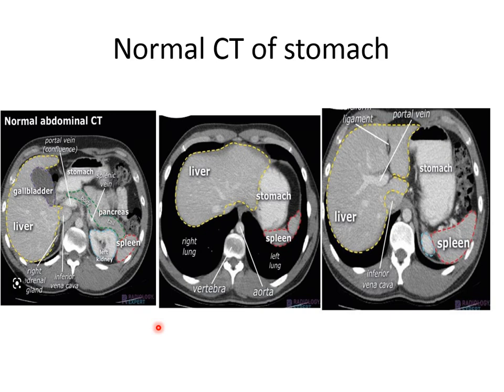Before starting the imaging of bariatric surgery and its complications, and how they appear on radiological imaging, let's review the normal anatomy on the CT scan. First, in the pictures on the right side, this is a normal abdominal CT. This is the stomach. As you see, it's more anterior. In this view you will see the liver, and this is the stomach. There is also a little bit of small bowel, but it's not so prominent.